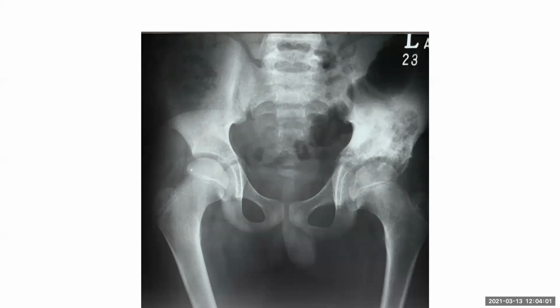In fact, if I may take back, I think it's the reverse. It's the left femoral epiphysis which seems to have decreased bone density, and the acetabular region also seems to be a bit sclerosed on its superior aspect. The joint space appears relatively reduced on the left side.